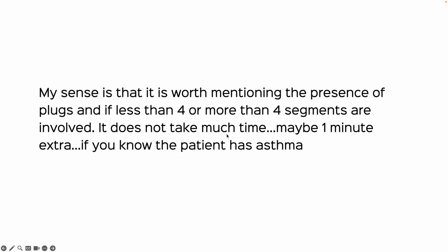I don't think that patients are going to be coming in to say, okay, look for mucus plugs in asthma. But asthmatics do come for CT scans for a variety of reasons. One of them is, of course, ABPA related, but the other is just to look for other complications. I think it takes just a minute to identify areas of mucus plug when you're scrolling on your workstation.